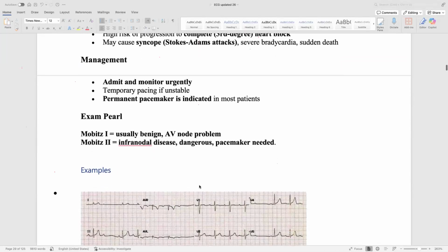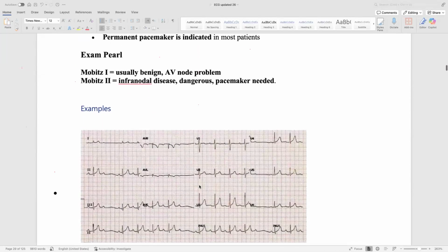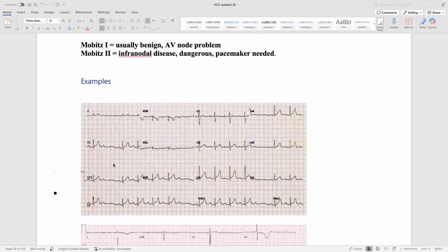Example. If the ECG is looking, you finish the rate: bradycardia. How much is the rate? 1, 2, 3, 4, 5, 6, 7. So 300 divided by 7, it is like 40 something. Very slow rate. But there is a narrow QRS complex. Alhamdulillah, there are some fibers working.